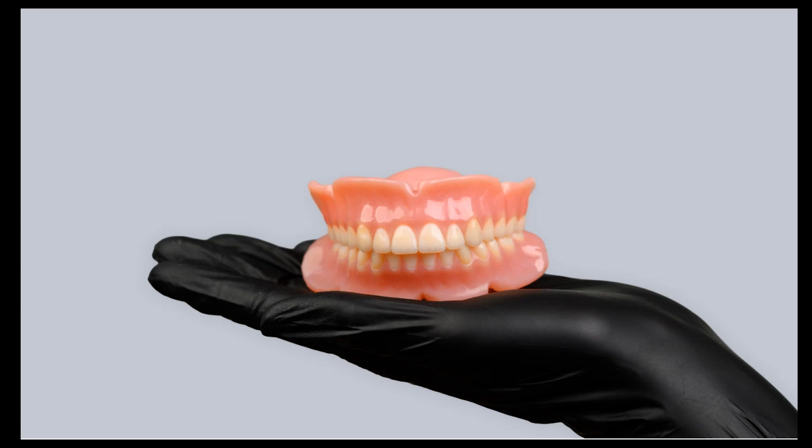If you want to turn off the internal structures, you need to select only the anterior teeth, meaning both the canines and the incisors. The internal structure is disabled for the posterior teeth. This is why you can see in this selection that the toggle for the internal structures is in the middle. It contains both models that are compatible with internal structures and models that are not. So it's disabled for the posteriors, and now when I select the incisors and the canine, because it's a partial and there's only one canine here, I can turn off the internal structures for the entire case. And now when I select all of the teeth, you can see that it's turned off.